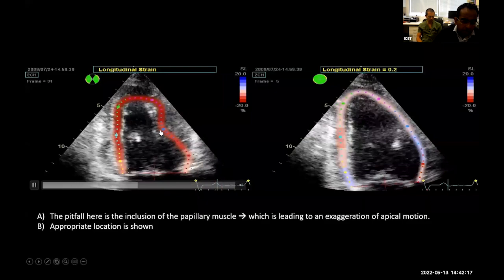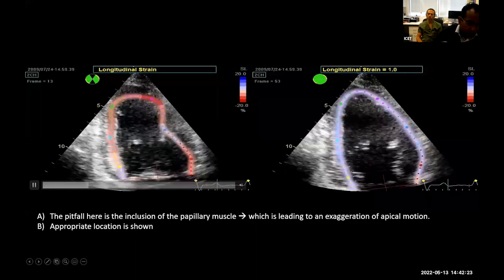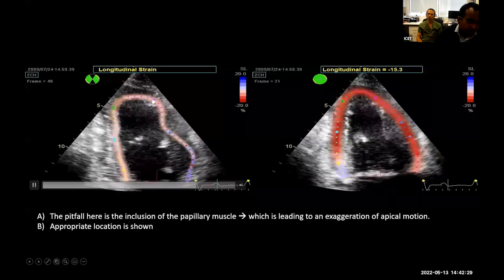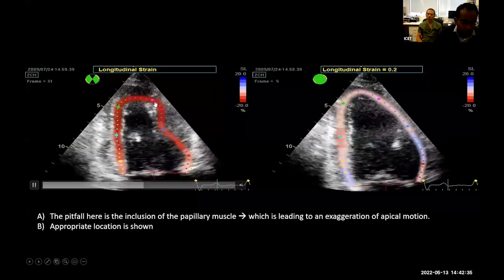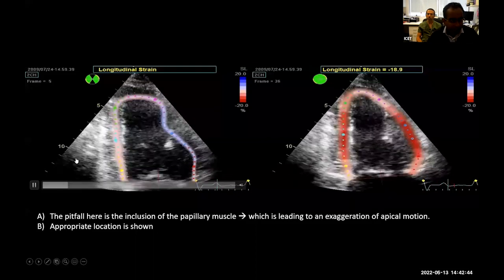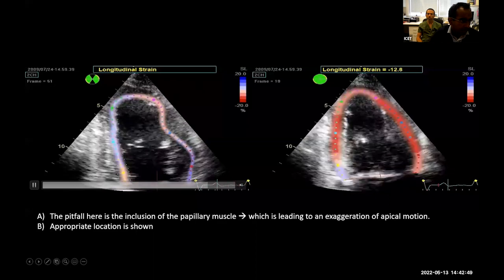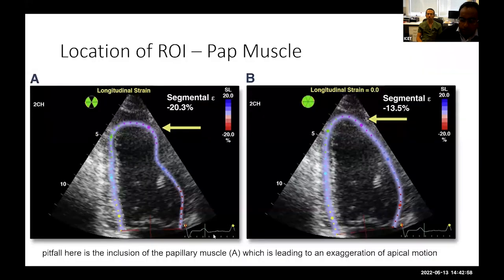And for the initial example we talked about, I can still do strain, but it's not tracking a certain segment. Let's say the pink segment is not tracking well. In that case, I can just click on the pink segment and it will exclude that as part of the measurement or algorithm when you do the strain analysis. So it will only include the other 5 segments and exclude the pink segment, if that makes sense. Hope that helps. Hope that makes sense, Ravi.